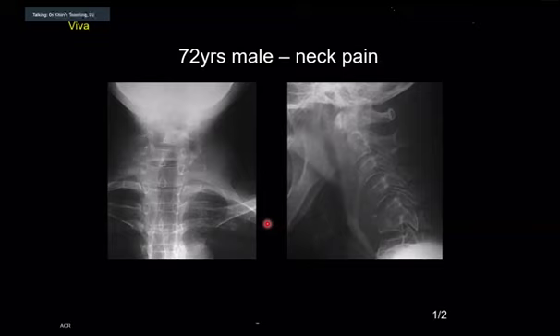Why do you say that? Because the simple reason is that we are doing a chapter on infection. The margins are irregular, like this disruption of the end plate superiorly. And what is happening to the intervertebral disc? We've lost the intervertebral disc. So that is the key.